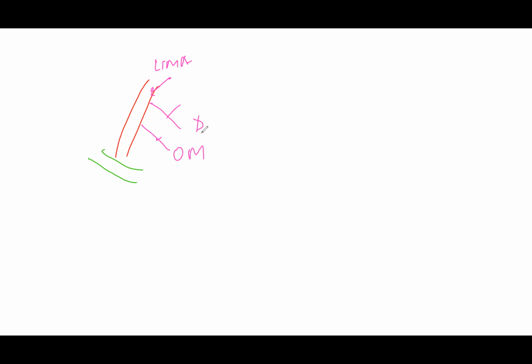Then there's another graft which is kind of a Y sequential graft, where the Lima, if it's coming like this, let's say, to the vessel, and there is a graft coming like this, and then from this graft, there is another graft.